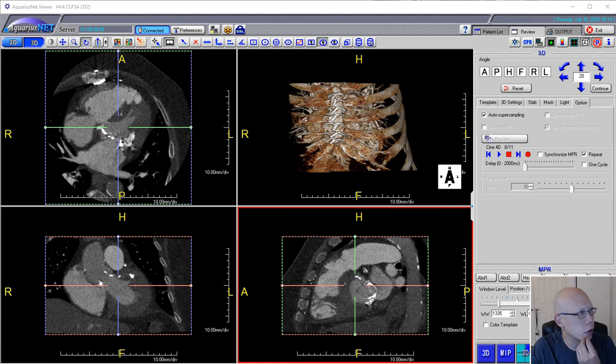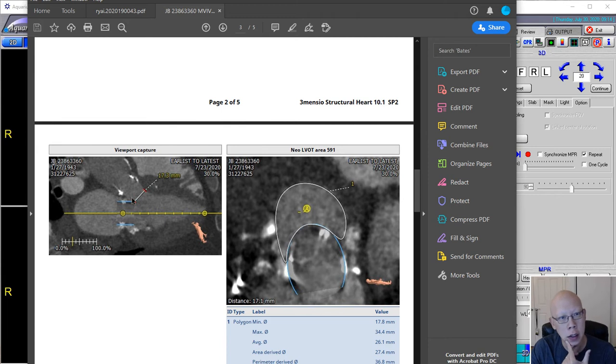All right, here's my attempt at getting an LVOT measurement for a mitral valve surgery, an interventional procedure. The key thing is to try to identify a plane across the LVOT where the device will potentially obstruct the LVOT. So you can see in this report that's been done already that the cross-section is measured not at the location that we typically do for TAVR, for example, but at a measurement where the device will sit within the existing bioprosthetic mitral valve.